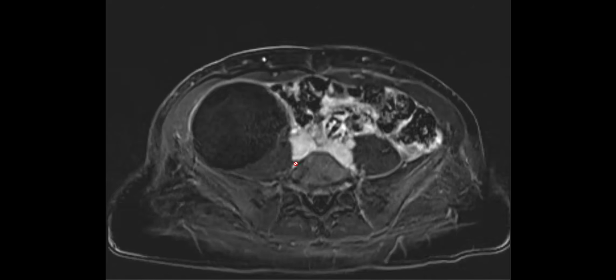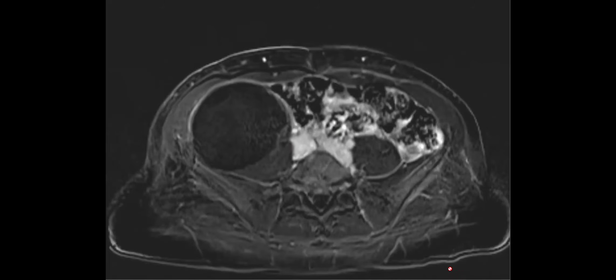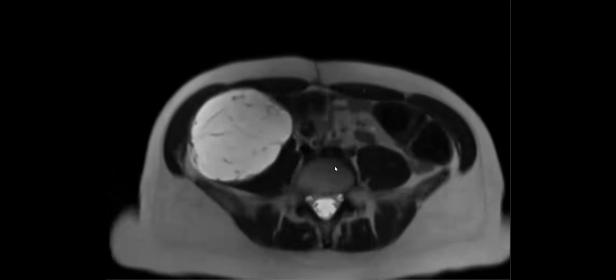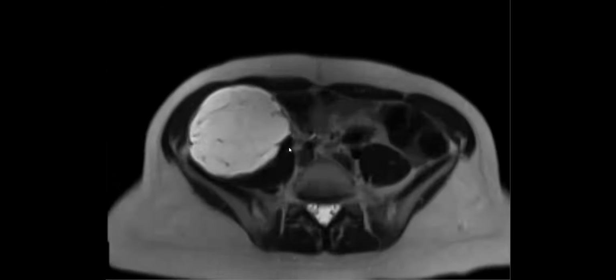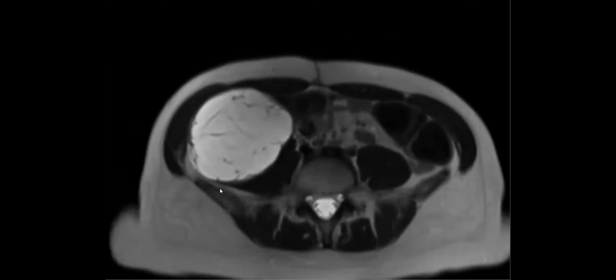So we were like, this is a retroperitoneal cystic lesion. We were asked, is it a lymphangioma? It does not really look like a lymphangioma, not blobby. It has these septations. It also has this claw sign with the psoas muscle. Then we were thinking, could it be a retroperitoneal mucinous lesion? But I think Nelly hit the nail on the head in the beginning when she said claw sign with the psoas. Therefore, is it truly a muscular based lesion? So the surgeon actually brought up, could this be an intramuscular myxoma? And that's what it was.